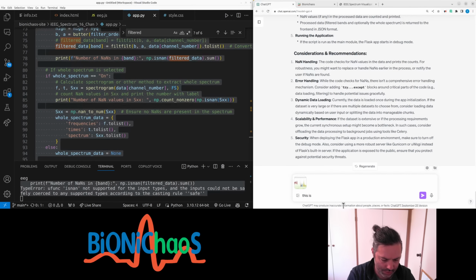And this is what the front end should look like, a front end layout, because we have different colors now.